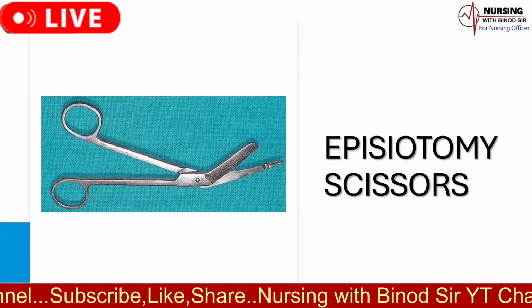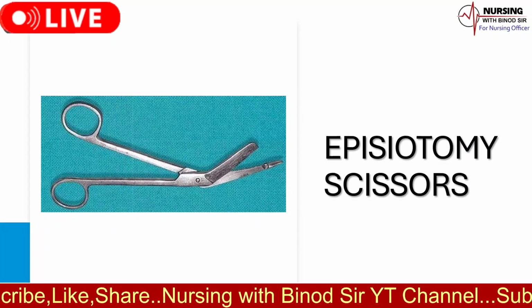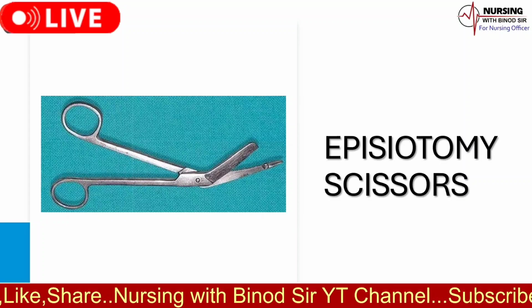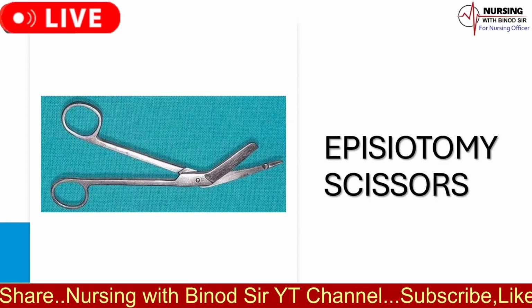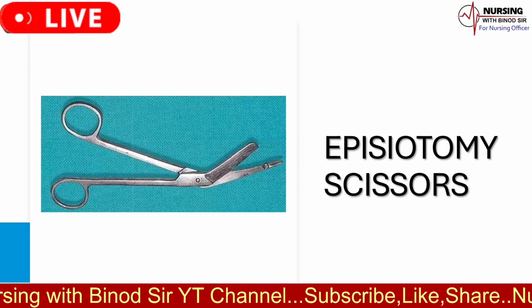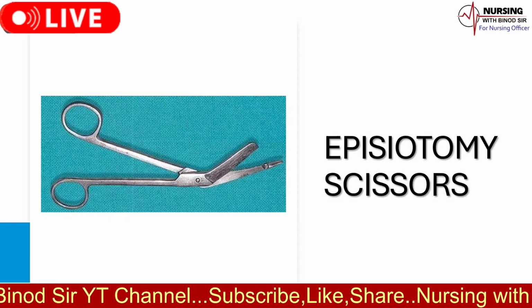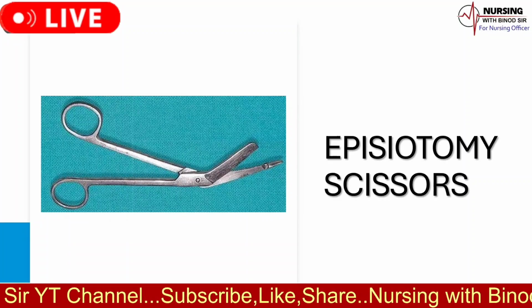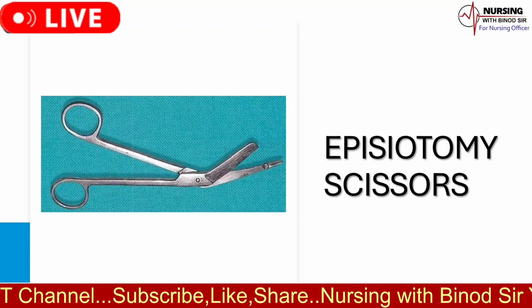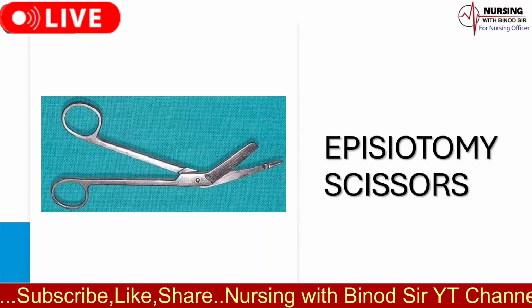2. Preventing uncontrolled tearing. These scissors help prevent severe and uncontrolled tearing of the perineal tissues during labor, promoting quicker and cleaner incisions. 3. Assisting instrumental deliveries. They are used during instrumental deliveries, example, forceps or vacuum deliveries, to create adequate space for safe passage of the baby. 4.